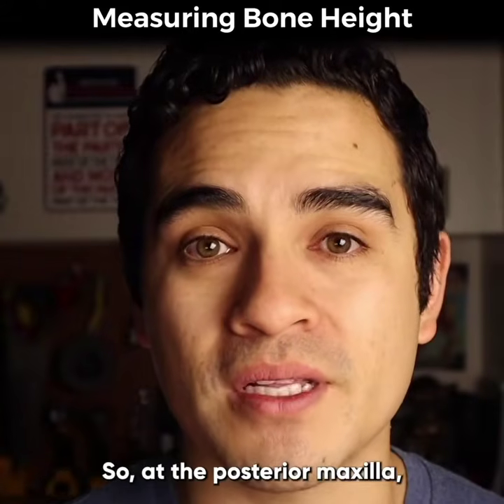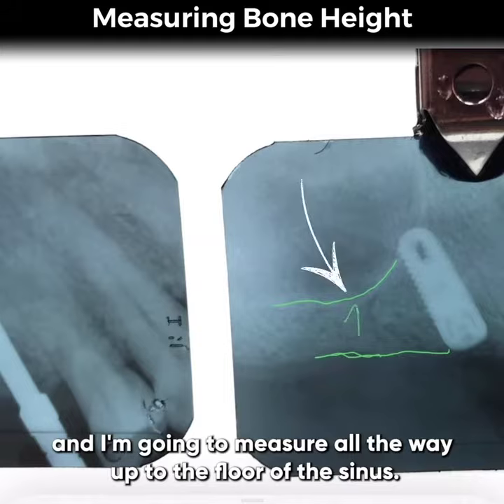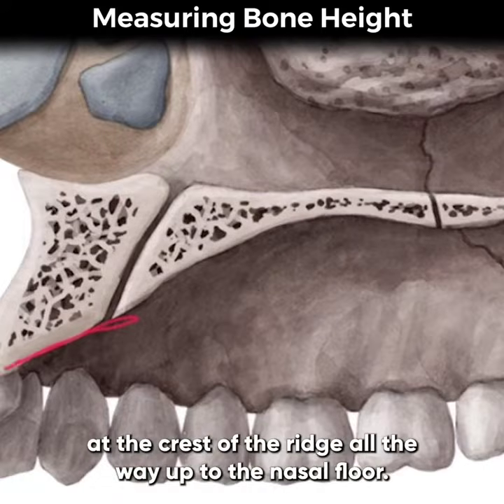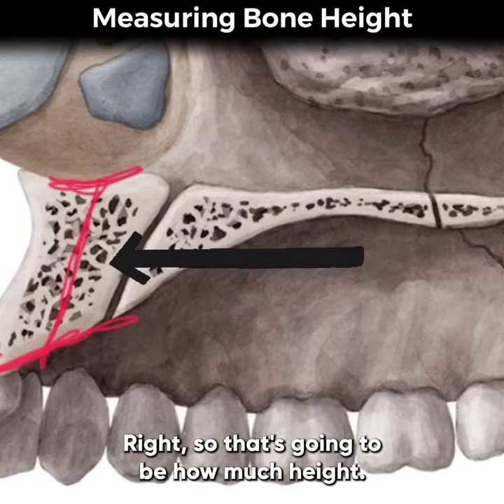So at the posterior maxilla, I'm going to start my measurement at the crest of the ridge, and I'm going to measure all the way up to the floor of the sinus. Then in the anterior maxilla, I'm going to measure at the crest of the ridge all the way up to the nasal floor. Right, so that's going to be how much height.